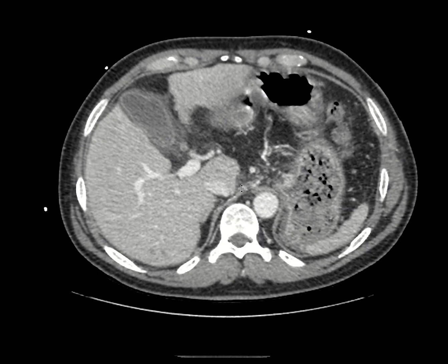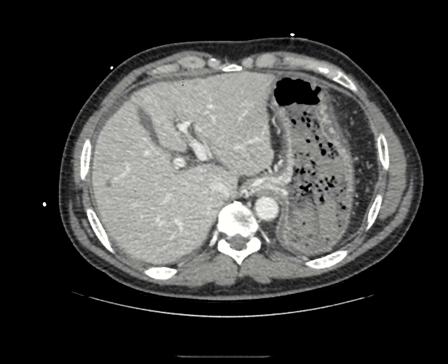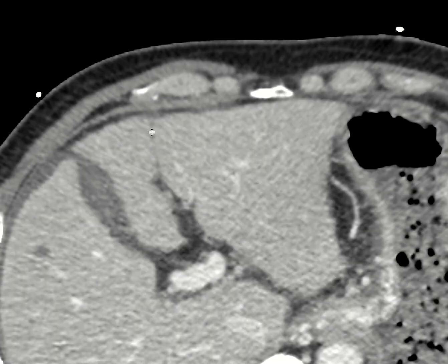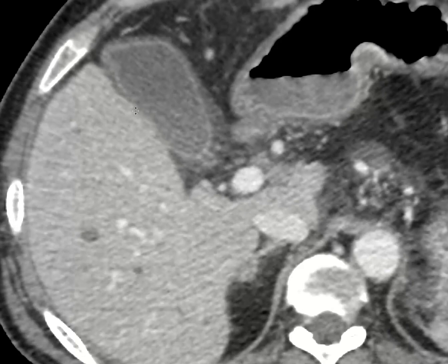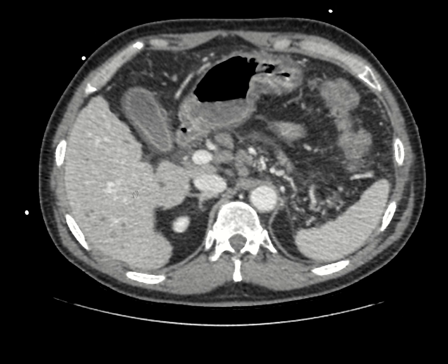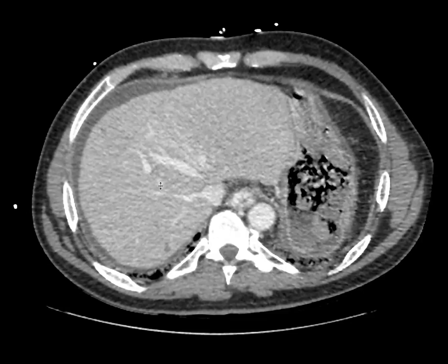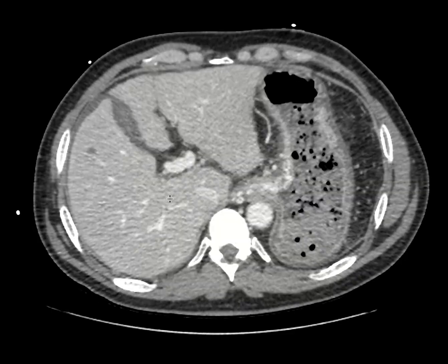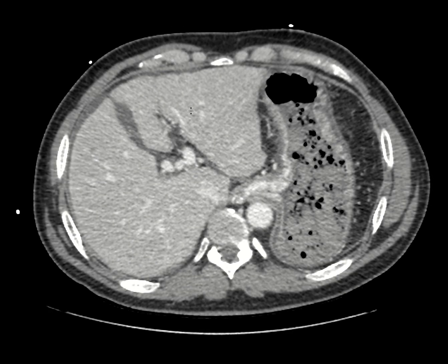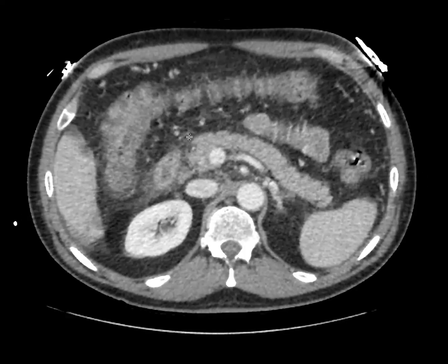Gastroesophageal varices are primarily seen in the setting of cirrhosis, and so we'll take a close look at the liver, and sure enough, when you look at the liver surface contour, it does appear nodular. Coming down a little bit more inferiorly, you can see the nodularity of the liver more inferiorly. And so this is a patient who actually did have cirrhosis that led to portal hypertension and esophageal and gastric varices.